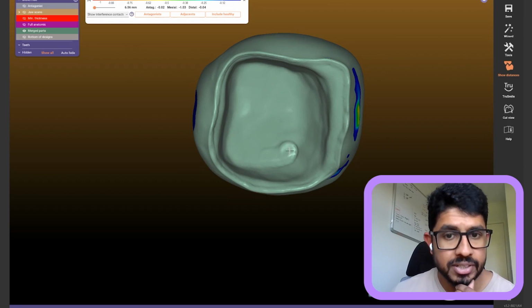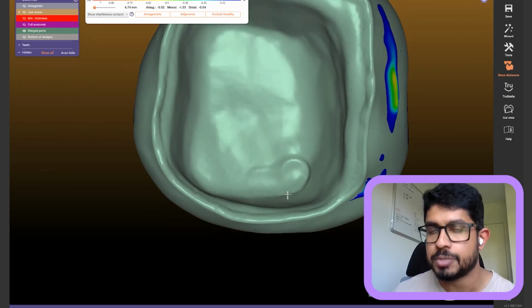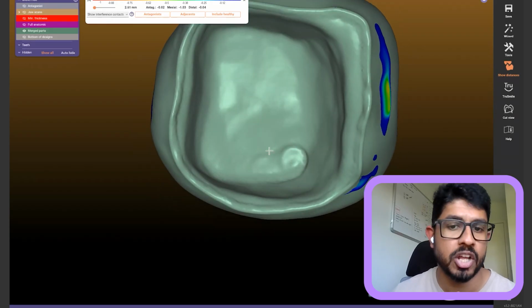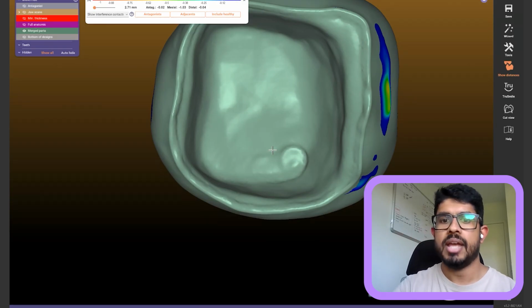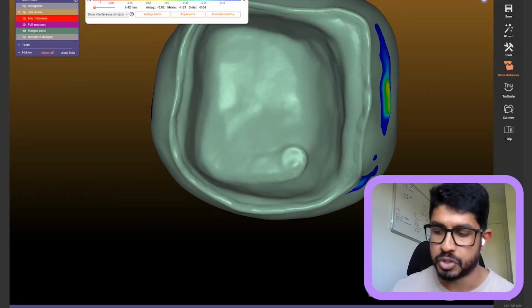So this is something, when you look at that, you don't see that in there. That's because you probably forgot that option, because CEREC accounts for that over milling, which a lot of people forget about. So for those of you who still want to try go into exocad, and you have a CEREC milling machine, and you want to go ahead and mill on CEREC, this is the option that you're missing out on. So that's just an extra tip for those who didn't know about that.